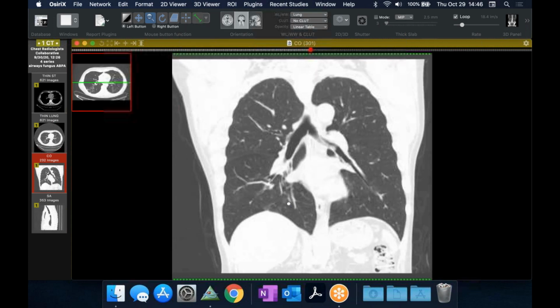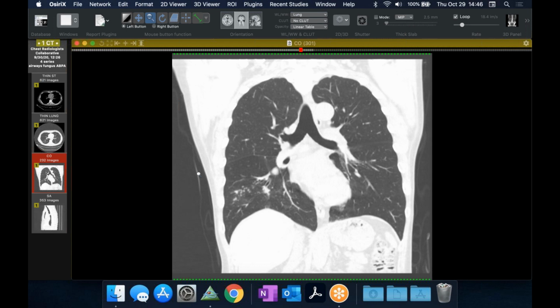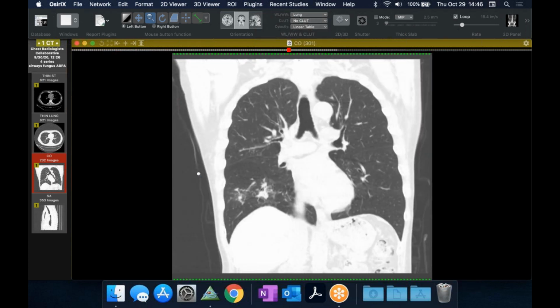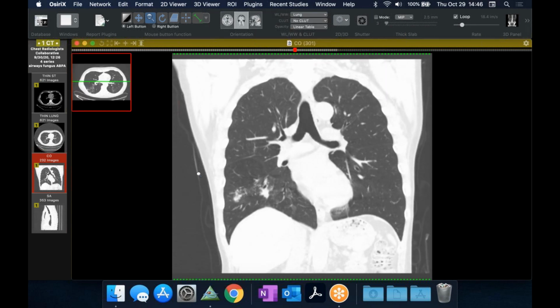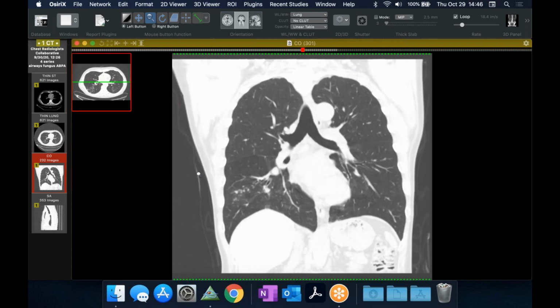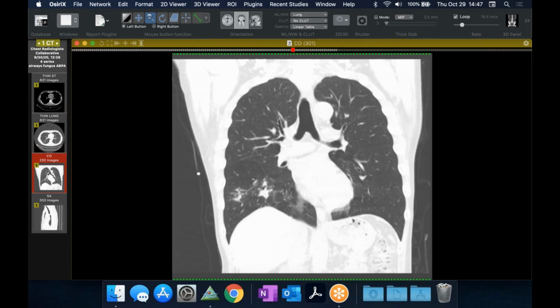All right. So this is an interesting case. This patient's in his 60s, I think, and developed a cough. He had been hanging out in Arizona for a while and was planting some trees and digging in the dirt and developed a cough. He's a retired veterinarian, doesn't smoke, doesn't have any other real major medical disease, and got a CT scan that looks something like this.